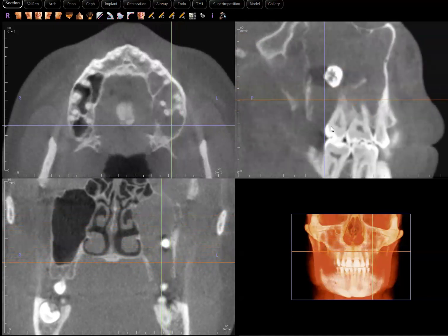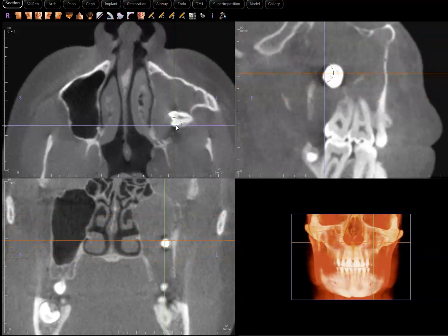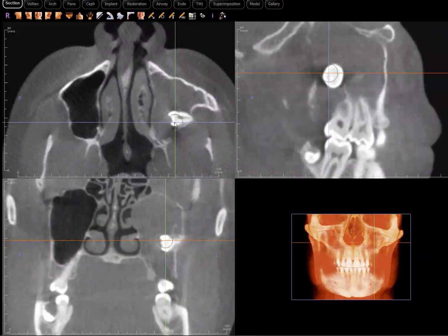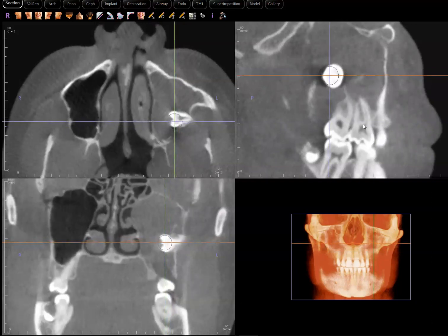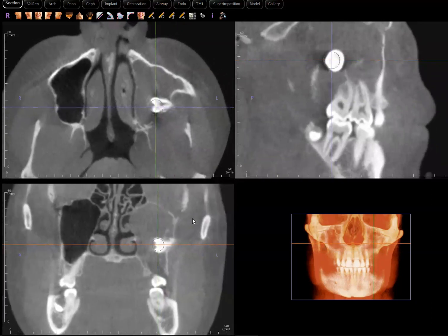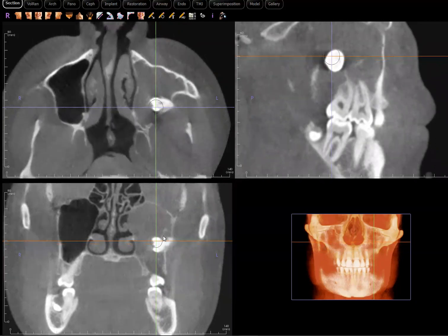Of course, you've already seen the title, but this is an example of odontogenic keratocyst that has been histologically confirmed. So here's an example of OKC. Many OKCs that I see are in the posterior mandible. So this is an interesting case to share with you because it involves the posterior maxilla and maxillary sinus. So there are things that we can learn from this, right?